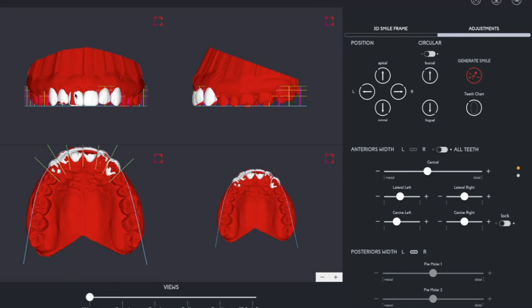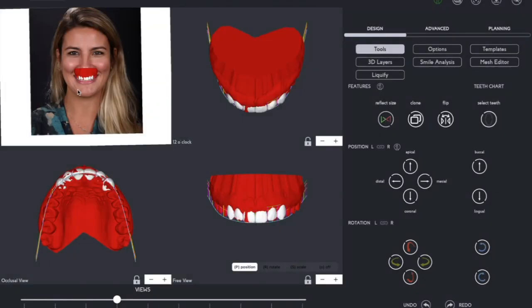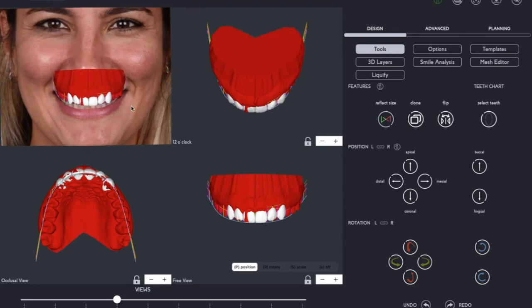And in this video, I want to show you how you can remove this excess so that you can use this mock-up without the patient's existing tooth covering the mock-up. So let me now go here and tap next. Okay, all right, so just by looking here, we can see that we need to make some small adjustments. Let me first go over here in the top left corner and select mock-up and shells. And let's go here to tools.